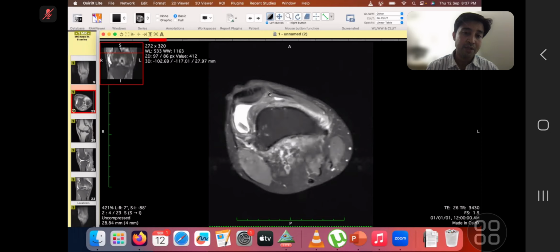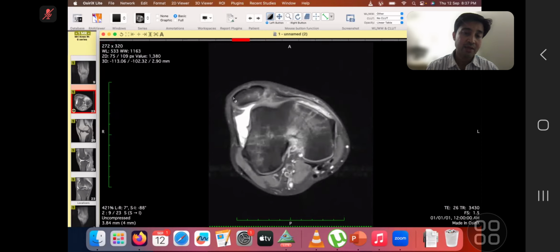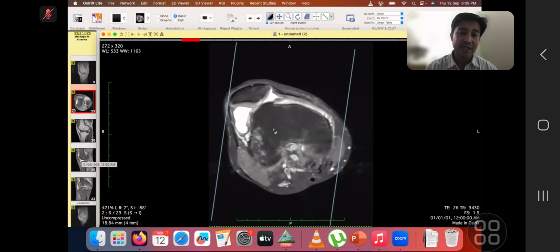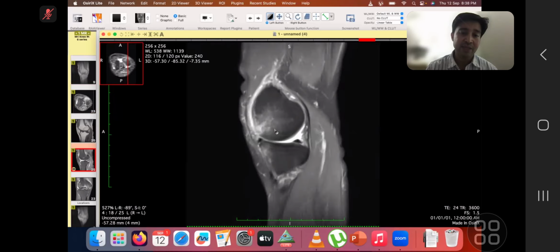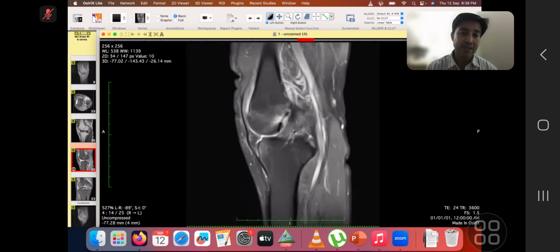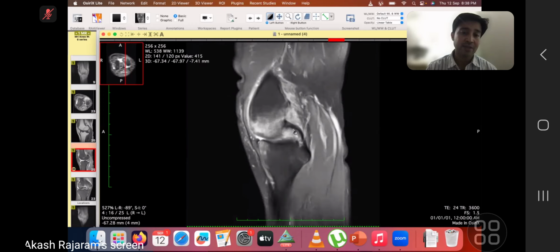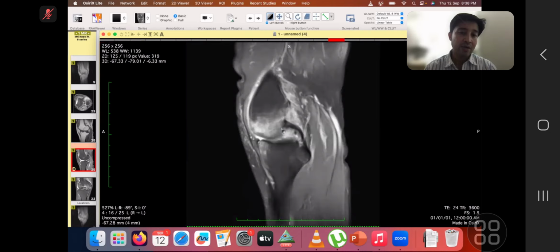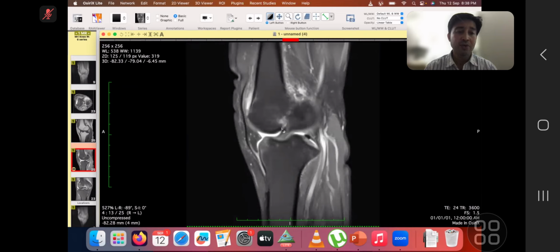With the patella position, if you see, it is quite displaced. It should be in this trochlear notch, and you see it's displaced. So this is lateral patellar dislocation. There is no significant ACL injury, as you mentioned. You mentioned ACL injury, but that's just some strain in the region of the ACL. So there's just an ACL strain and this lateral patellar dislocation. And also there is joint effusion. So overall, you did very well, candidate 4. All the best.